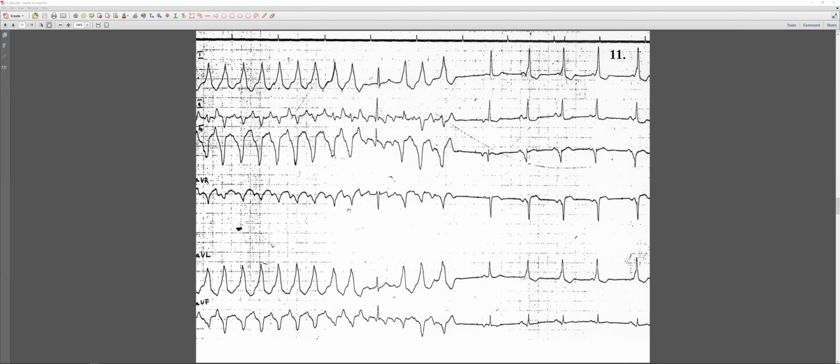Yeah. Great. Okay. So I guess this one can be divided into parts. So let's start from this part. From this part, I guess.